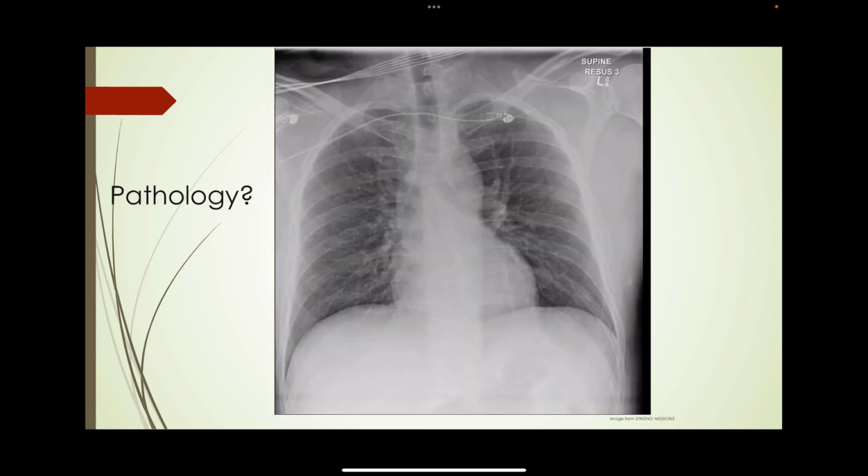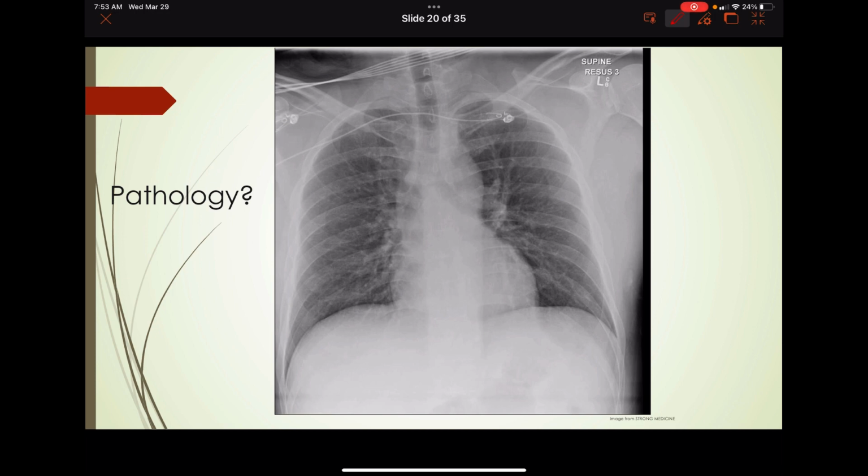And on to some pneumothoraxes. So here we have airway, carina. Airway's clear, I don't see anything in there. And B for bones, I don't see much in the ribs. C for cardiac silhouette, heart looks good. D for diaphragms. So this diaphragm here goes really deep on this side. You can see this right here. And you can see that it's a supine film.